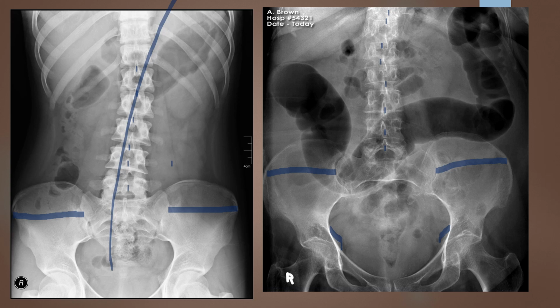As we go up to the shoulders, if my spinous processes are moving to the patient's left, that would mean my patient is slightly RPO. So their shoulders and their hips are not acting as one singular unit. We have a little bit of RPO rotation of the shoulder, a little bit LPO rotation of the hips, but overall, nothing very significant. So that would take it into the acceptable phase.